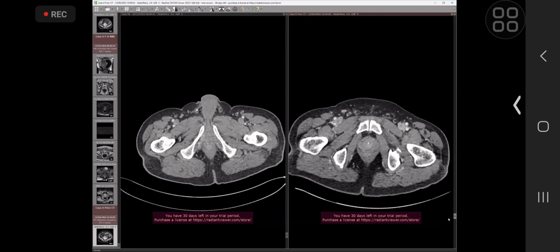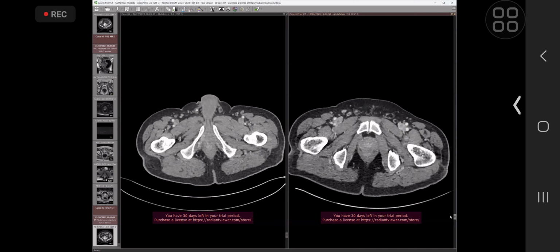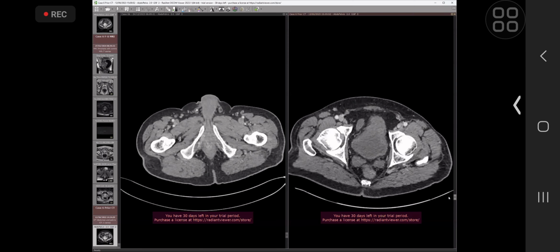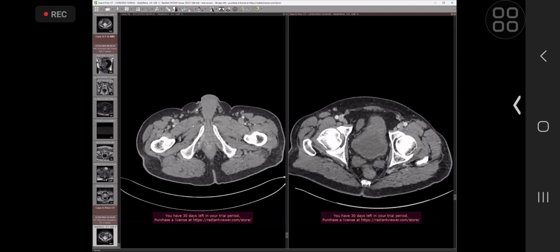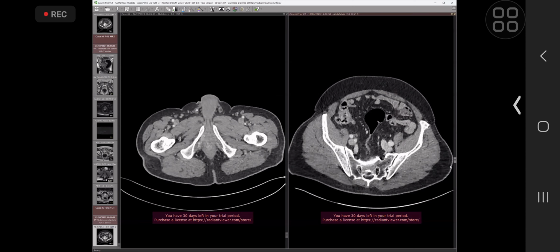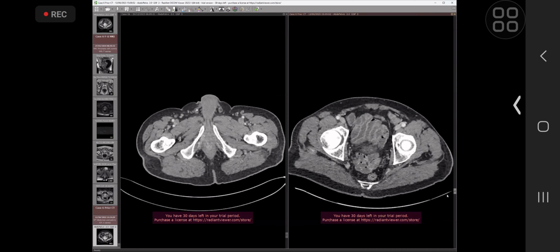Yeah, it looks normal in this scan. The prostate is normal in the average size. The rectal wall is well delineated, and the pararectal, mesorectal fat is clear. The bladder is clear. Both seminal vesicles look normal. So quite a dramatic difference in this scan. There is abnormality. I cannot see any diverticular disease here also, or anything in the rectum, because this might be a possibility as well. Looking back to the colon here, there's some diverticular disease, some tiny diverticuli here.